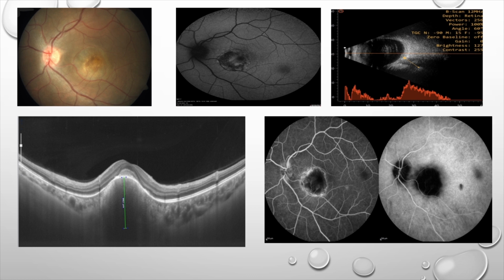So the tumor thickness was less than 2 millimeters. There is some lipofuscin pigment, the orange pigments that can cause hyperautofluorescence. In the B scan we could not measure. There's a subtle retinochoroidal elevation. In the B scan, there is the absence of SRF, subretinal fluid, and this is the FFA picture showing. So the B scan OCT shows no subretinal fluid.